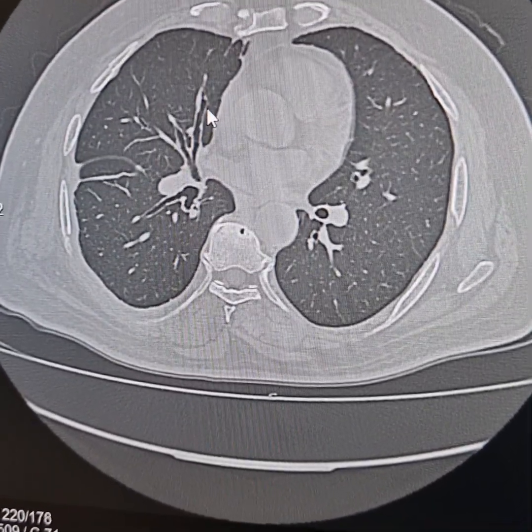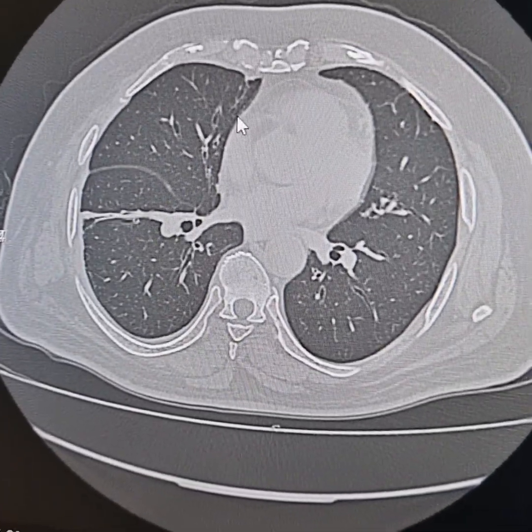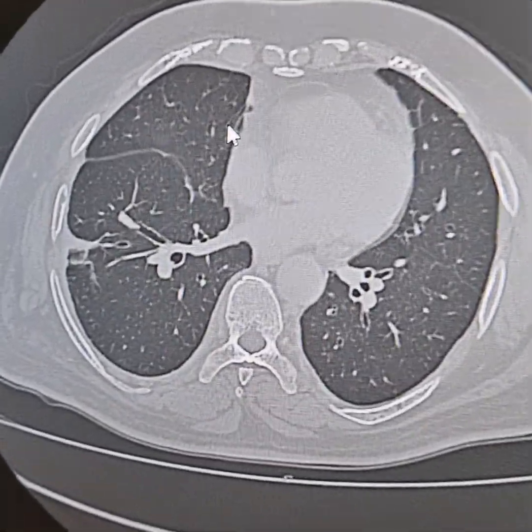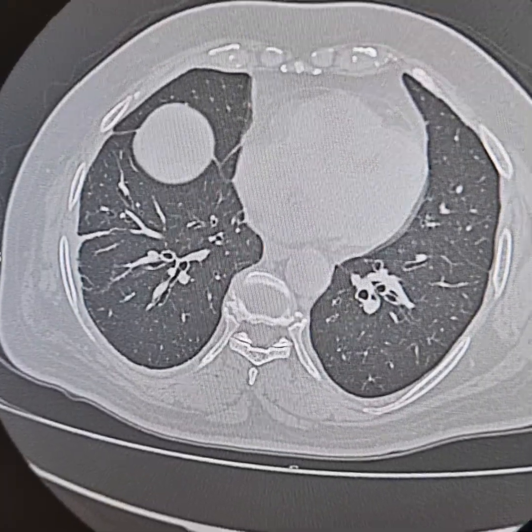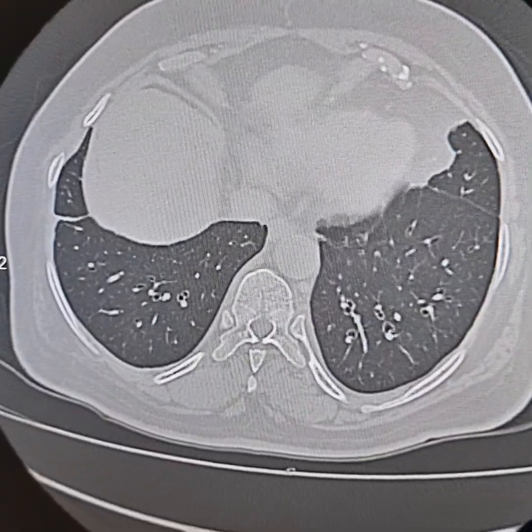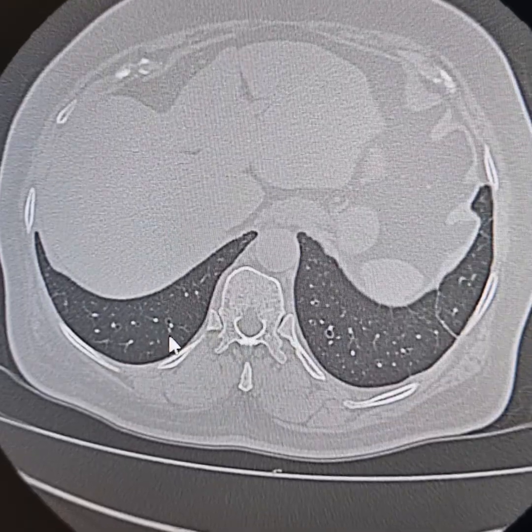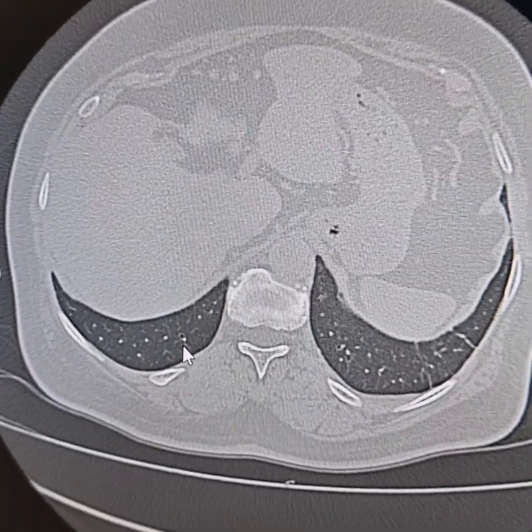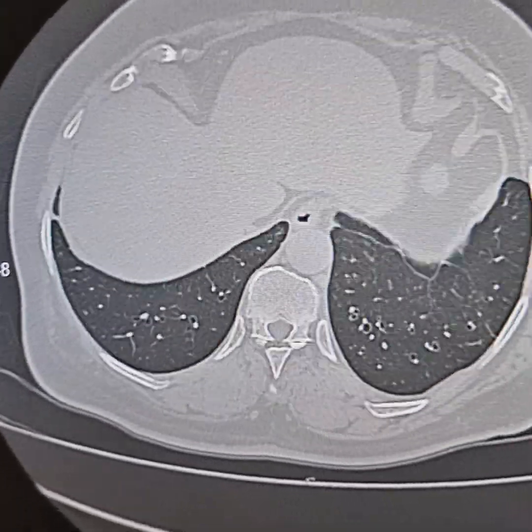Similar tubular bronchiectasis in the medial and lateral segments of right middle lobe. Please see these dilated bronchi. Similar dilated bronchi are present in the basal segments of both lower lobes as well. Normally the bronchi are not traceable up to this periphery, but these are traceable quite up to the periphery. So there is mild bronchiectasis.